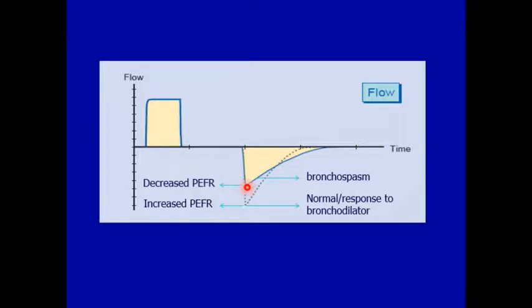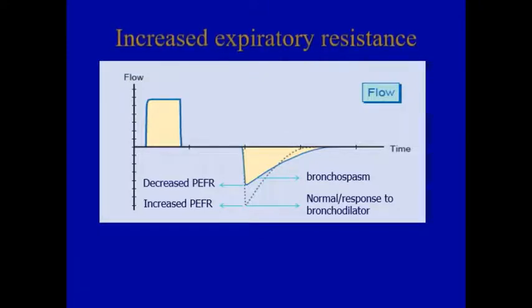When we administer bronchodilators to this patient, the peak expiratory flow rate increases. Whenever the airway obstruction is reversible, there will be a response to bronchodilators.